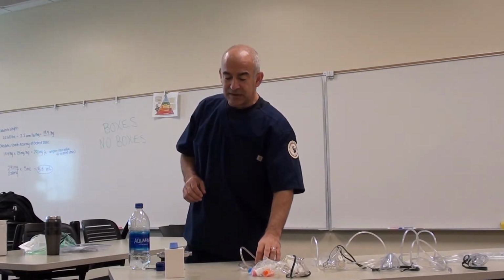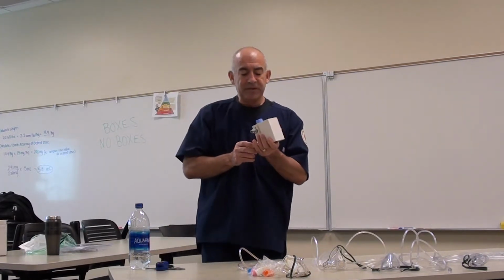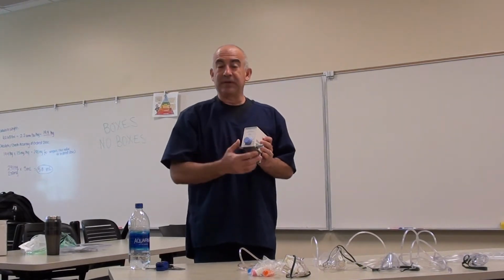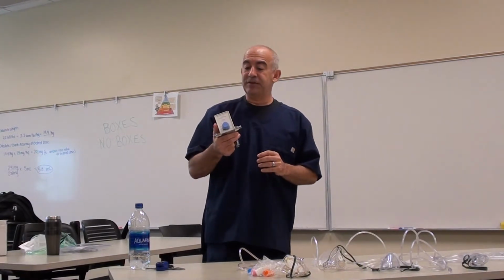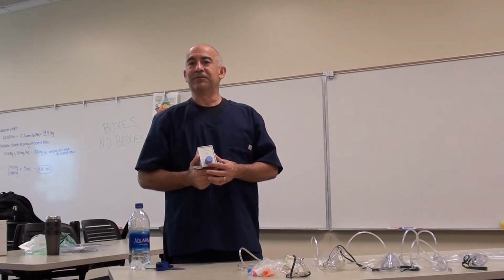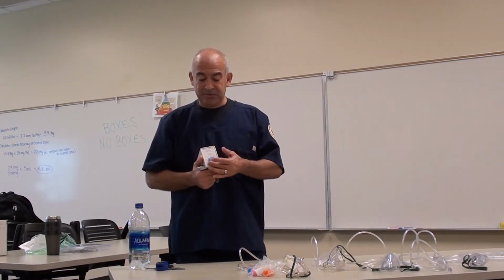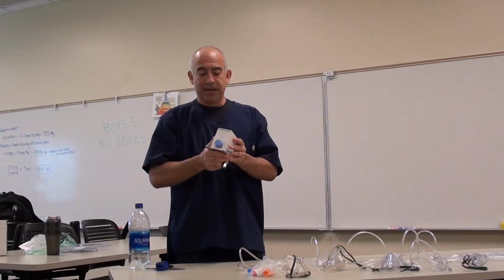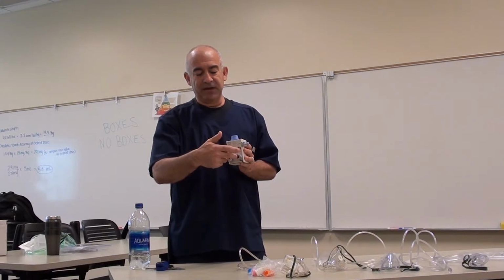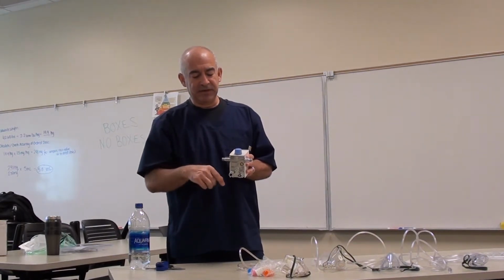The next device I'm going to talk about today is the oxygen blender. This is an oxygen blender, and what it does is it blends room air and oxygen together to deliver a precise FiO2. The FiO2 range of this particular device is 21 to 100%, so it's considered a full range device. 21% being the room air that we're breathing right now, and then up to 100%, and that's done by the supply of air and oxygen into these ports, and it proportions and blends it right in here.